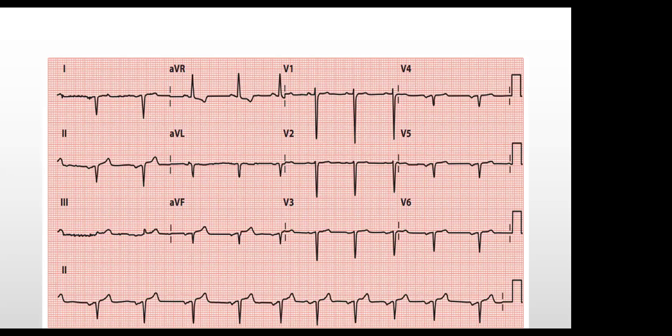Okay. So we shall further confirm that most likely it is dextrocardia. Dextrocardia. So that's correct. If you look at the ECG, you're almost seeing a reversal of what you would normally see.